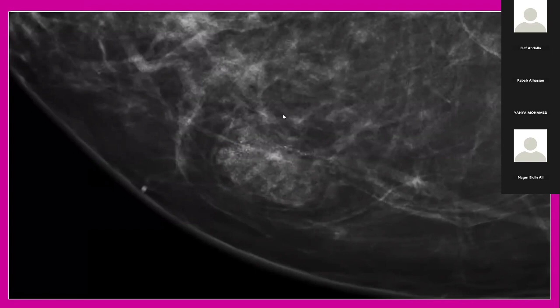But if you concentrate on this posterior lateral portion, the capsule is incomplete, which is not a big deal, as you can see a hamartoma with an incomplete capsule. But the tissue from this mass extends even beyond the capsule, which makes it suspicious, and it is associated with microcalcifications arranged in a linear pattern, which also upstages the lesion.